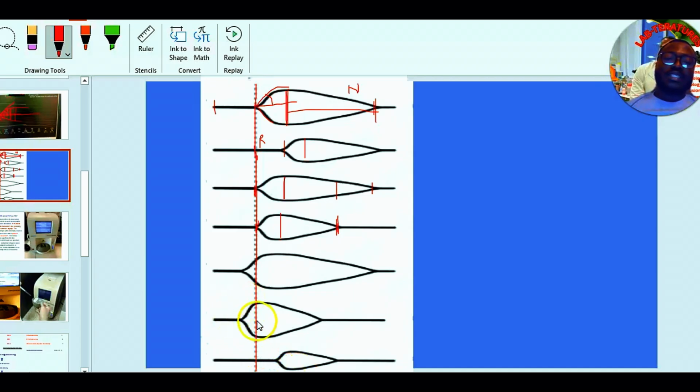So immediately you see this side is abnormal, that side is abnormal, first stage of DIC. And the abnormality is because here there is a quick initiation of clot, that is the first stage, and then whilst it is prolonging, it is using up all your clotting factors. At a point you are clotting factor deficient, and still they are breaking down the smaller clots that you could even form, and this is the second stage of DIC. So you can interpret all this graph so easily, so simple. You shouldn't make mistake of it. We are done with TEG.